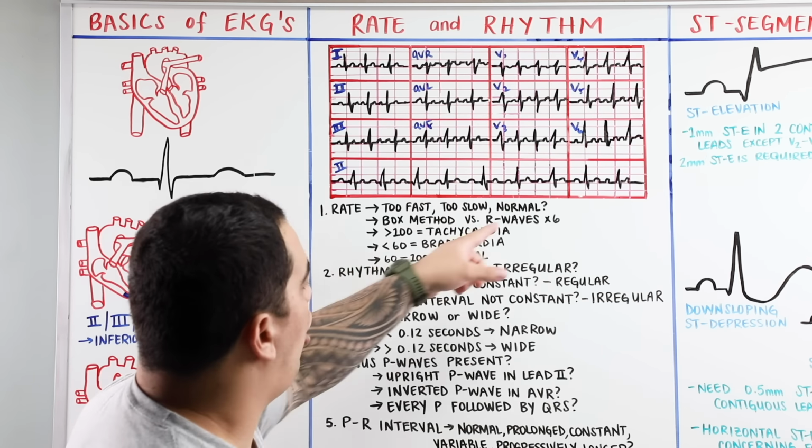Atrial flutter and SVT, we'll talk about those a little bit later. They can be very difficult to distinguish. But these are the 3 things I need you to remember as a part of your differential. Next thing, is it tachycardic? Is it irregular? Is it narrow? There's 3 more differentials I really need you to remember. First one, most common, AFib. Are they in atrial fibrillation?